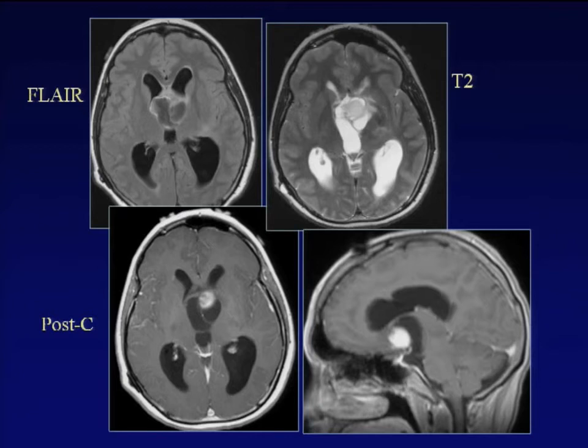This is another take-home message. We may see tumors with the same imaging characteristics, but with different age and location, there are different tumors. Here, if we are dealing with the imaging characteristics, this is a hemangioblastoma. But here it's a 10-year-old boy, and we are in the supratentorial compartment. So the most probable diagnosis here is pilocytic astrocytoma.